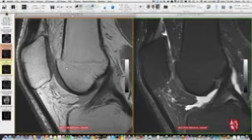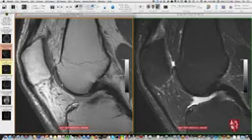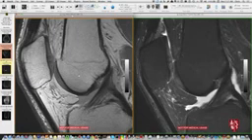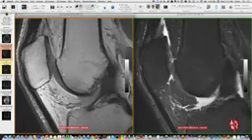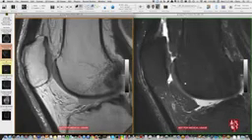Note that normally the patellar cartilage is a little bit thinner up top and thicker down below. It's kind of been likened to a pear shape, so thicker in the mid to lower portion than in the upper portion. The trochlea is a common spot for chondral degeneration, and so here along the femoral trochlea, it's nice and smooth and uniform in thickness, and you sweep around, seeing the midline of the trochlea here, and sweeping around, all looking quite good there.